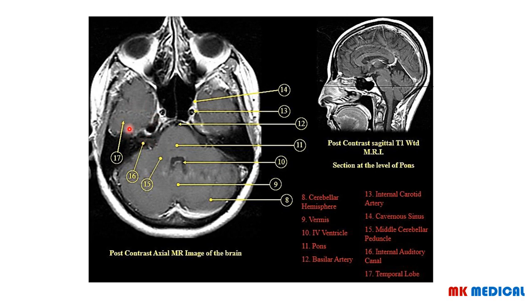Then we'll also get to see part of the temporal lobe, which is structure number 17 over there. So this is the temporal lobe. I hope you're actually absorbing a lot of this information.